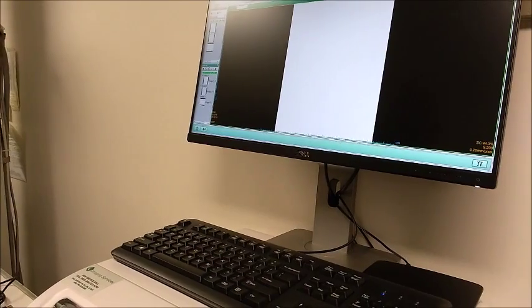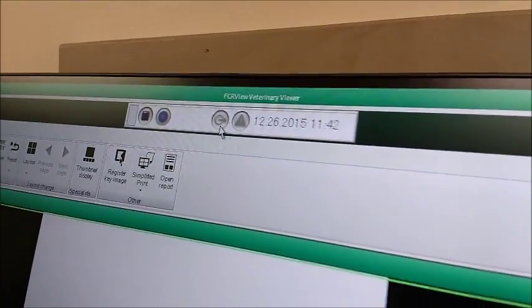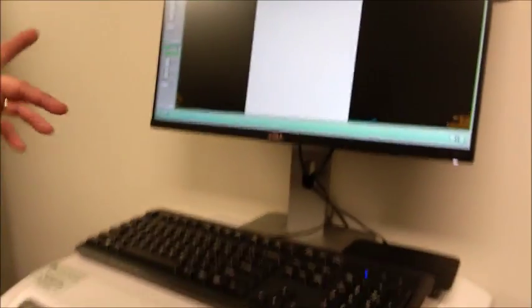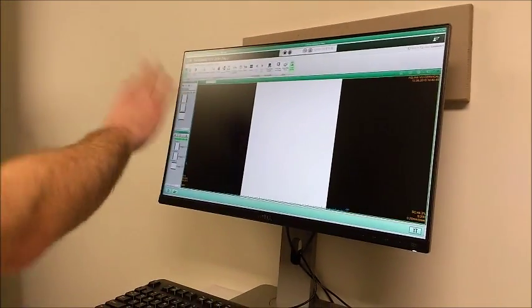No, actually, we could run another plate, but this is kind of like your backup control panel here. This little arrow is gray right now, but you'll notice when we complete a study, this lights up for a few seconds. That is when it's actually transferring over to the NAS. Okay.